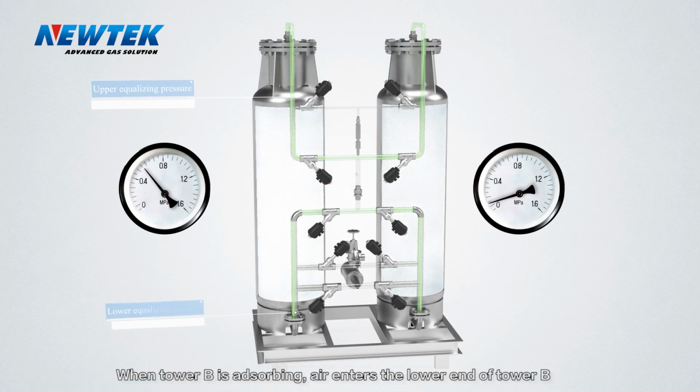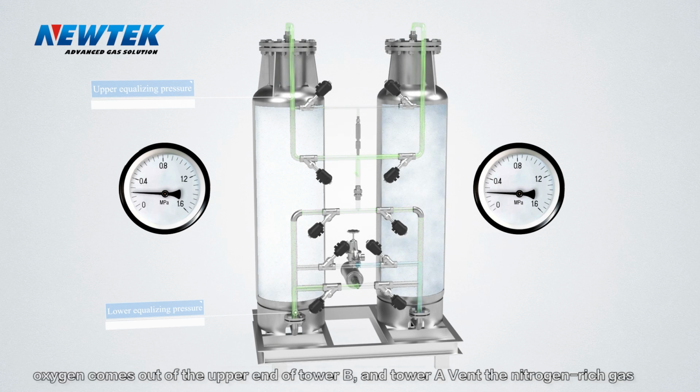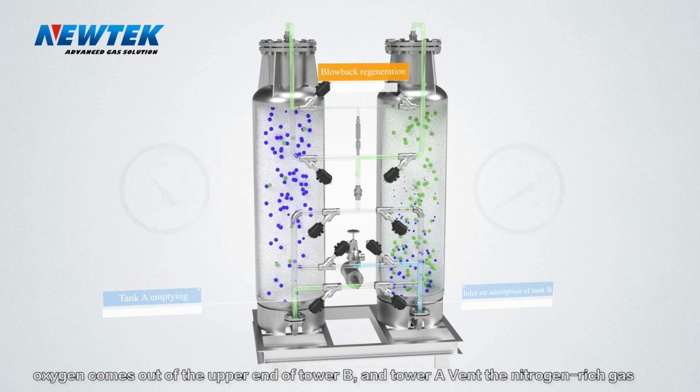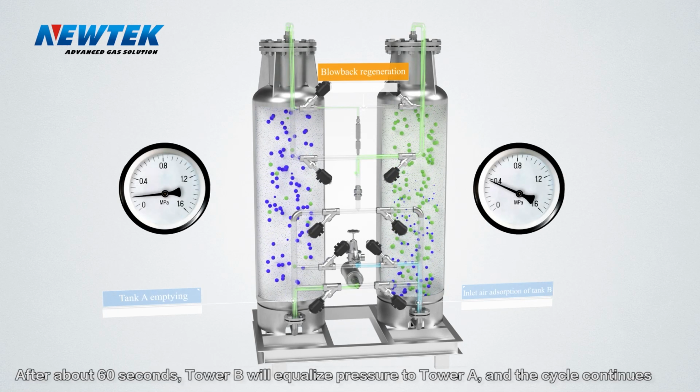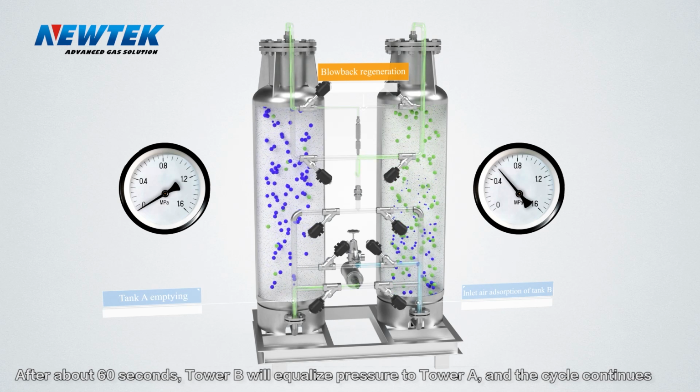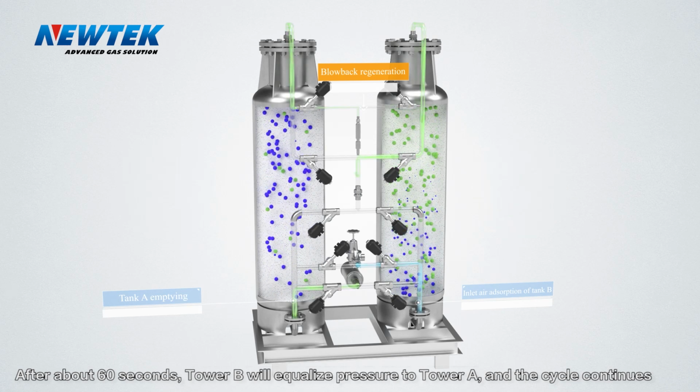When tower B is adsorbing, air enters the lower end of tower B. Oxygen comes out of the upper end of tower B, and tower A vents the nitrogen-rich gas. After about 60 seconds, tower B will equalize pressure to tower A, and the cycle continues.